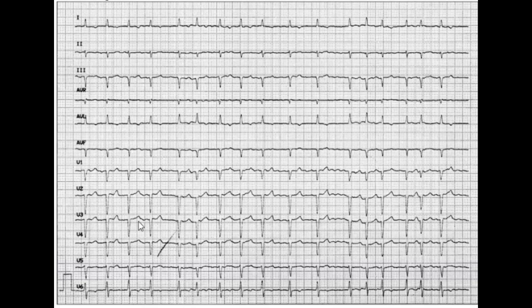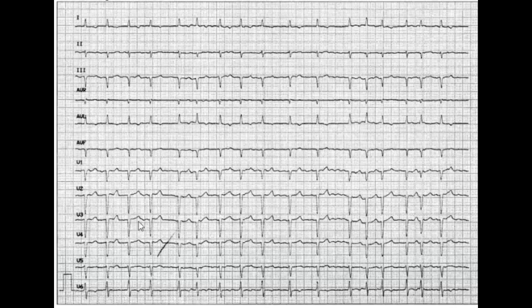So we see the Q waves, the pathological Q waves in lead 3 and AVF. So we suspect the scar in the diaphragmatic surface. So chronic myocardial infarction, which is not a real term, but that's how they write it in the ECG booklet. Chronic myocardial infarction in the diaphragmatic leads, so diaphragmatic myocardial infarction, chronic.